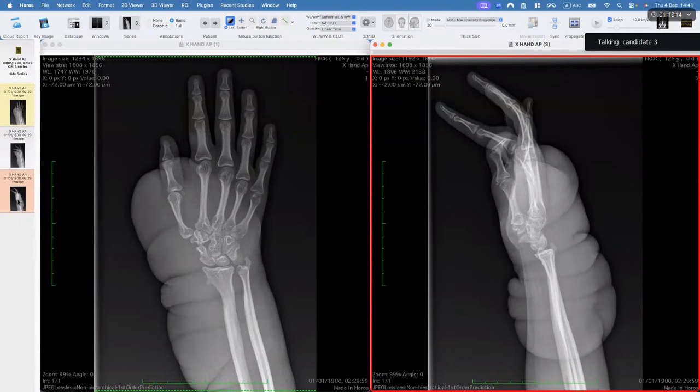It looks like the edema due to clearance of the lymph nodes in breast cancer patients. The other possibility, filariasis, can also give unilateral limb soft tissue swelling and edema. However, it's more common in the leg.